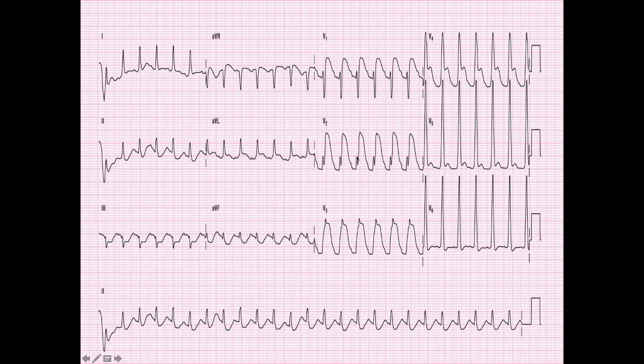If we follow this down, so where is the QRS complex? Where is the T wave? Follow this down. Oh, there's the QRS complex, right there. So ST segment elevation there, even though it looks like this weird thing. V4 elevated, V5 a little elevated, a little bit. V6, maybe a little depression, a little normal-ish, right?